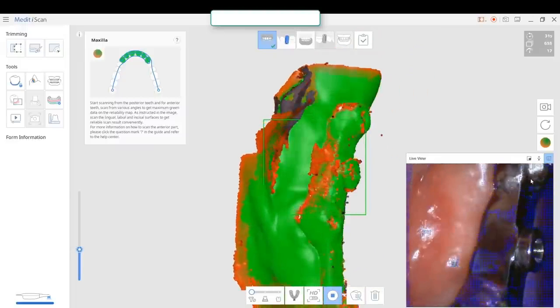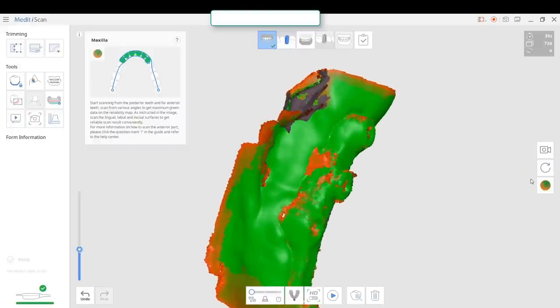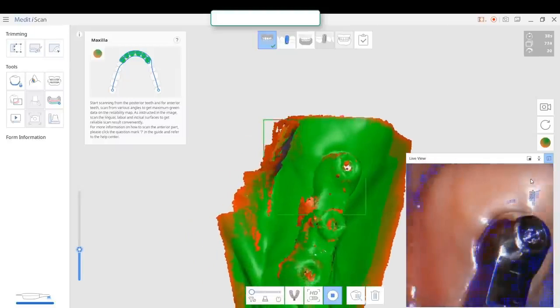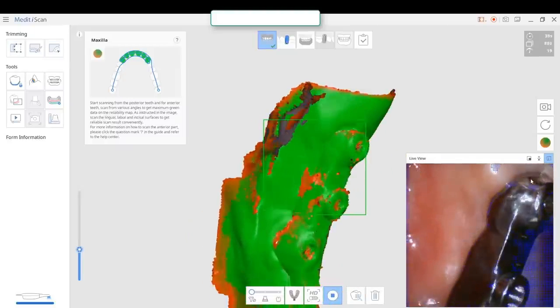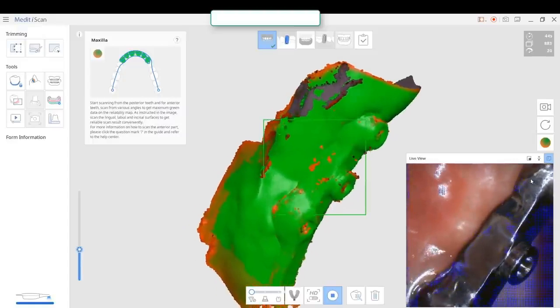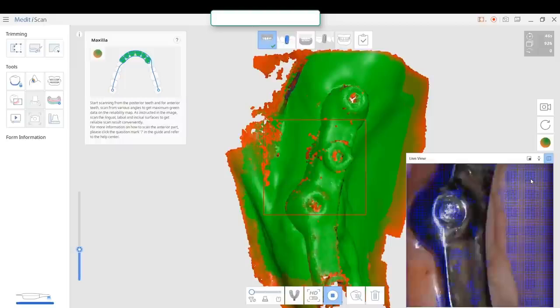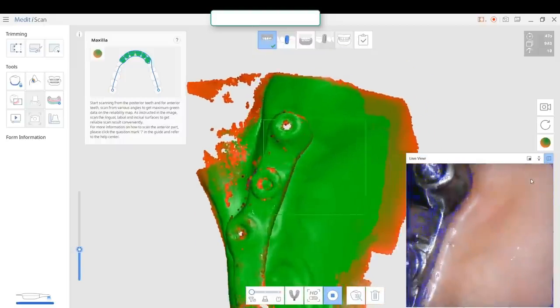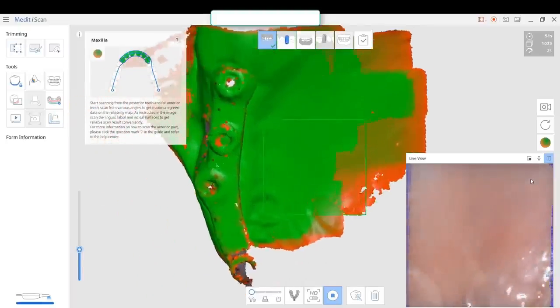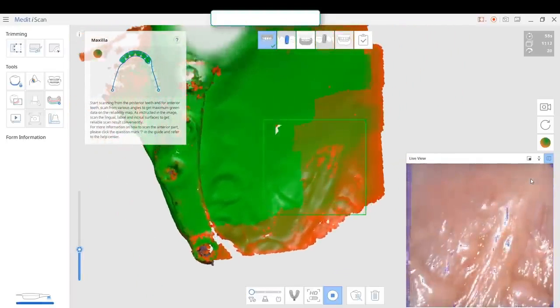And then if you look in the lower right quadrant, we have a live window, and anything that's purple in that live window, where there's a silhouette of it, is an area the camera or the software cannot see. So just by angling the camera and hitting it from a different direction, you channel the light to reflect off of that in a different direction so the cameras can pick up the images that are bouncing back off that object.